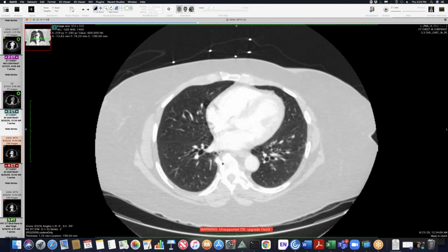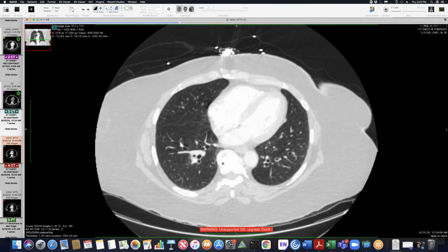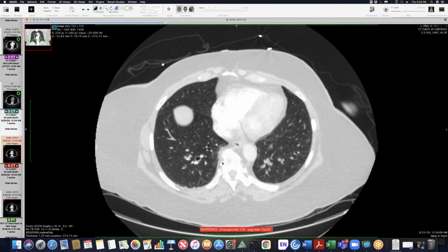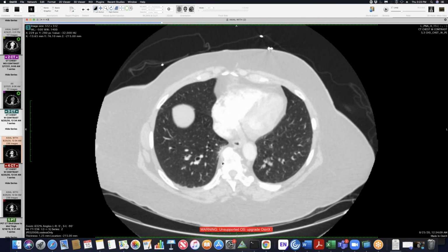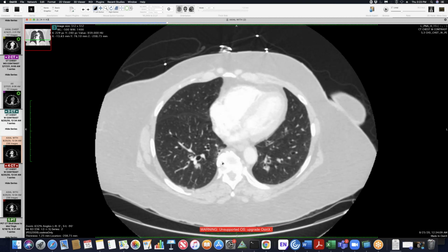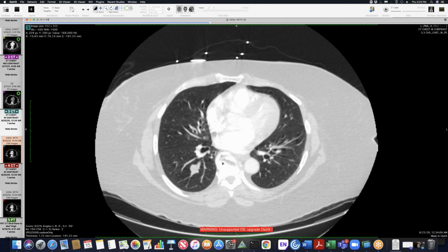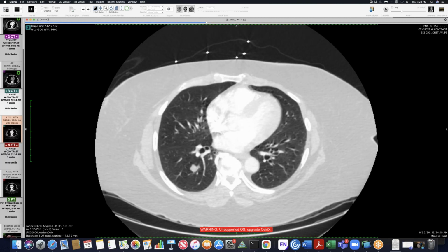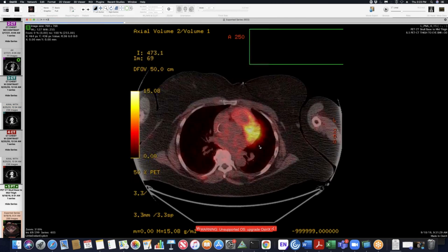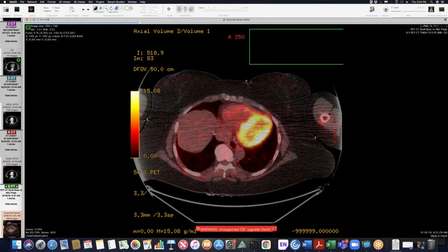the soft tissue, and then I went back a few studies back. I thought this one was the best. The first one I showed was from yesterday. This one is from August of 2020. Here's the soft tissue. You can see pretty low attenuation here. Probably fat. By measurement, it's negative 20, negative 30. So probably some fat in there. And then if you look at the airways, it's kind of interesting. You can see cylindrical bronchiectasis with some fluid layering there on both sides.